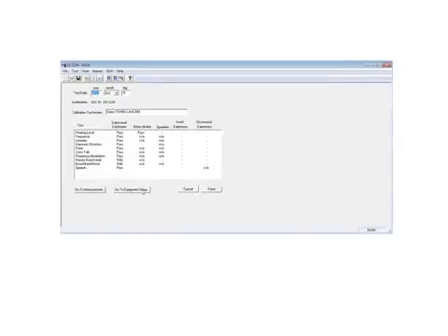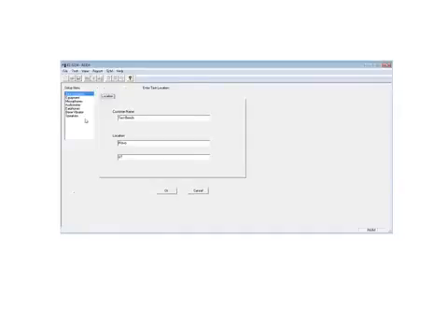The important thing here is to go to Equipment Setup and just verify which earphone we're using. In this case, we're using what's called a TDH50 earphone. This one appears in the standard. They're very specialized earphones, and they have exacting characteristics that they're supposed to meet, depending on the coupler that's being used to test them and the model of the earphone. You can see a number of different models that we can bring in corrections for. And there's also different couplers that you can use then to test the earphone.